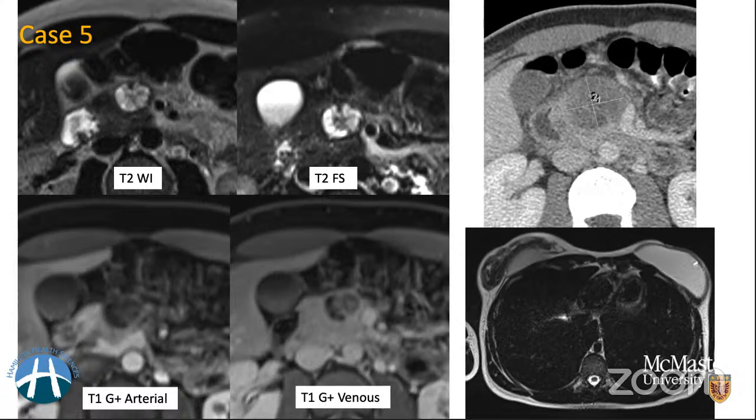If you pay close attention, the patient has bilateral implants, but on the right side you can see the glandular tissue. On the left side, you don't see the glandular tissue. So the patient has probably undergone a left mastectomy in the past, and the implants are probably just to balance it out. That got us thinking about why she had a left-sided mastectomy, and what it has to do with this. So that's something which we started to look for.